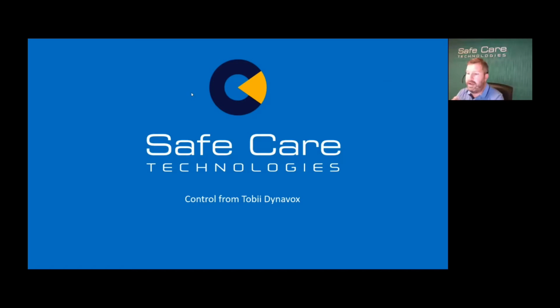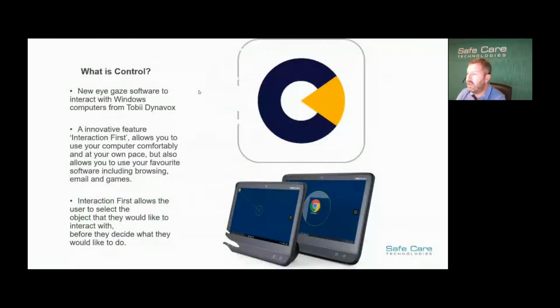We are looking at a piece of software called Control from Tobii Dynavox. So Control is relatively new. It came out with the new version of eye trackers, the IS5 from Tobii Dynavox. So it's launched about a year now. So it is a new eye gaze software to interact with Windows computers. So it's a way of controlling your Windows computer.